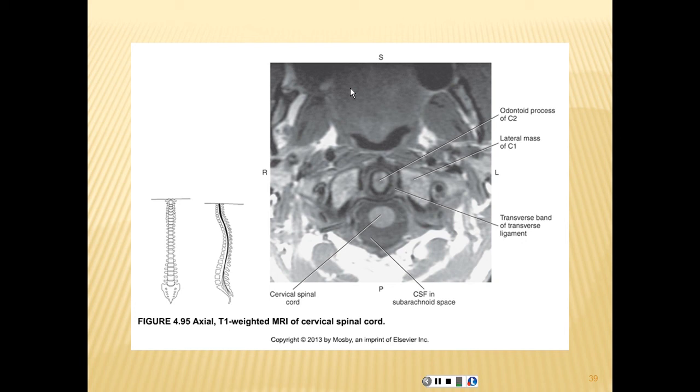The spinal cord is enlarged in 2 regions by the cell bodies of nerves that extend to the extremities. The cervical enlargement extends from the vertebral bodies of approximately C3 through C7, and the lumbosacral enlargement occurs within the lower thoracic region. Cross-section images of the spinal cord at various levels have considerable differences in size and shape because of the changing proportion of gray and white matter.